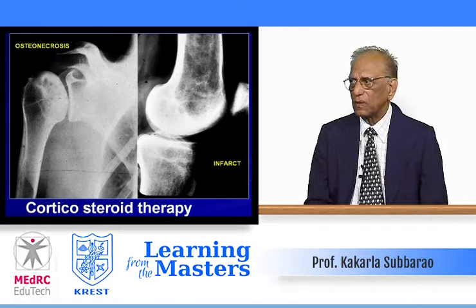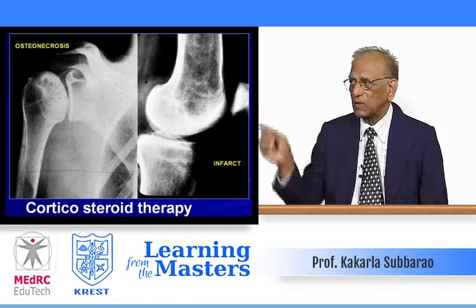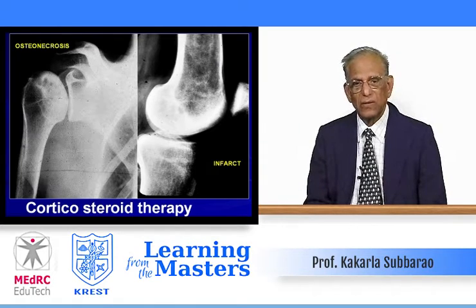Radiograph of the shoulder indicating osteonecrosis of the head of the humerus, this patient with corticosteroid therapy. On the other hand, if you look into the knee, there is also osteonecrosis, but look at the medullary area, serpiginous calcification with the fibrous membrane indicative of infarct.